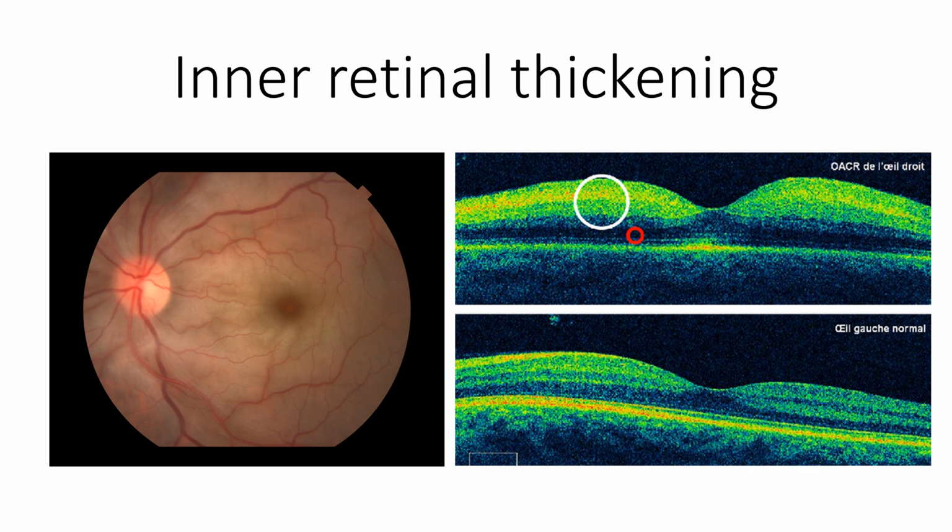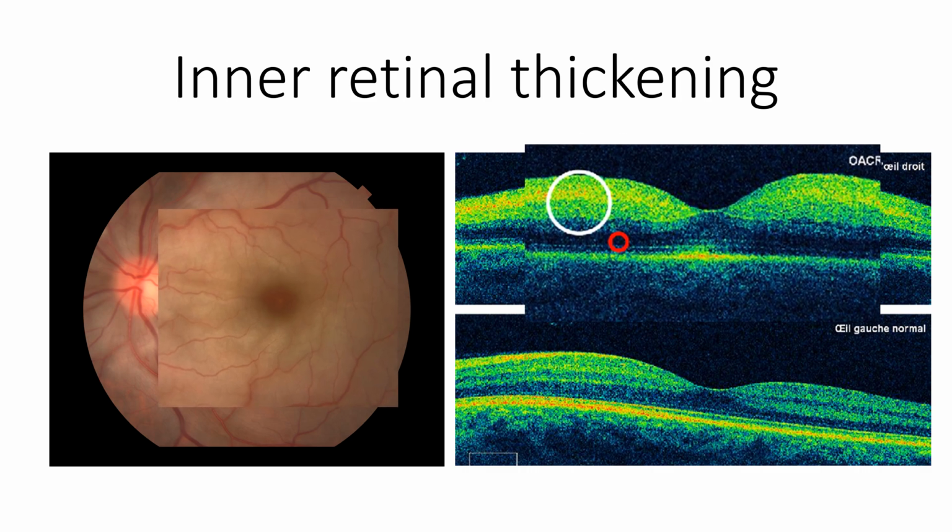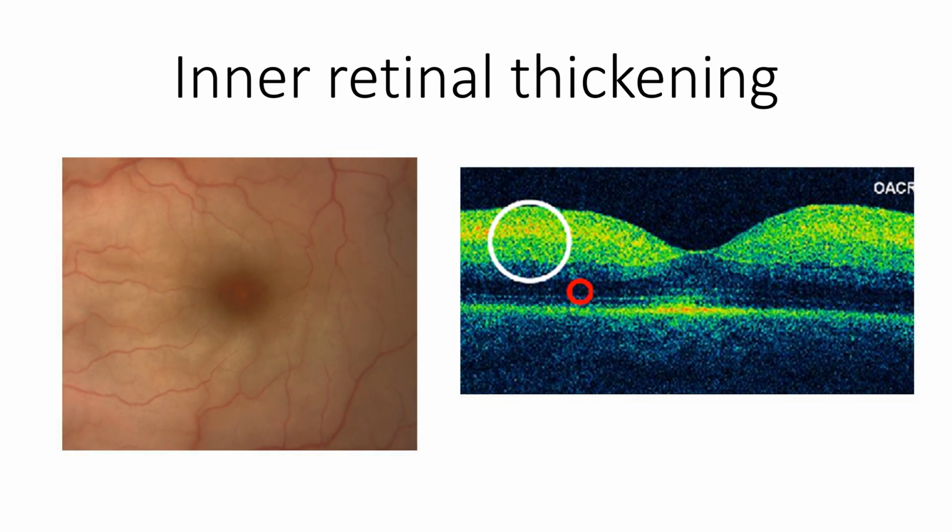Here we have a patient with central retinal artery obstruction, and if you look at this image, we have a cherry red spot here, which is basically an area where the retina is grossly thinned out. So we have visibility of the retinal pigment epithelium and choroid circulation. And when this is compared to the rest of the retina, it appears edematous and opaque and white. So this area is highlighted in the form of a red spot, which is known as the cherry red spot.